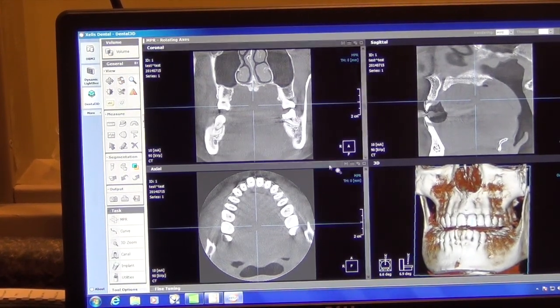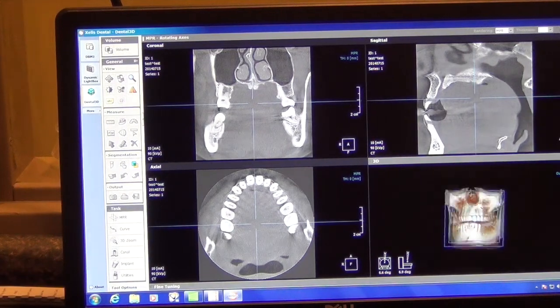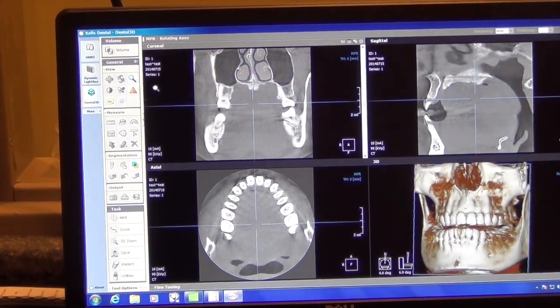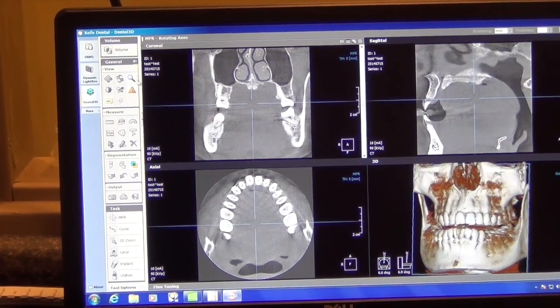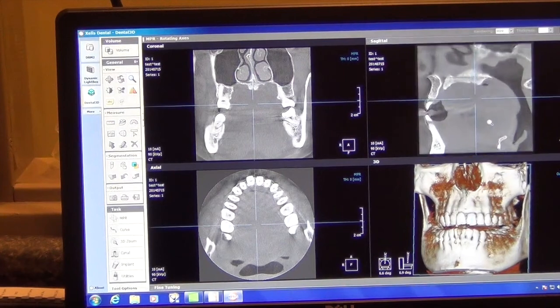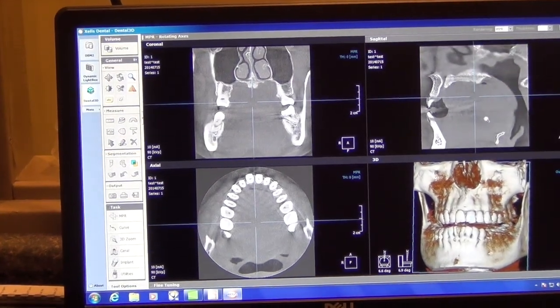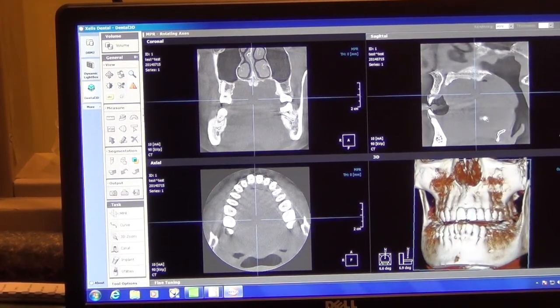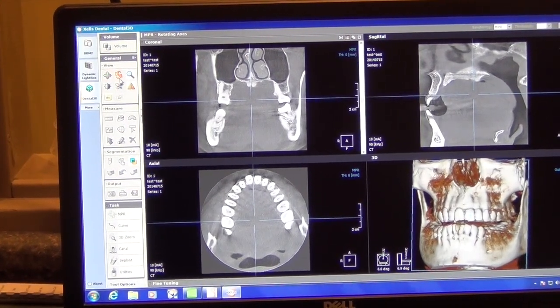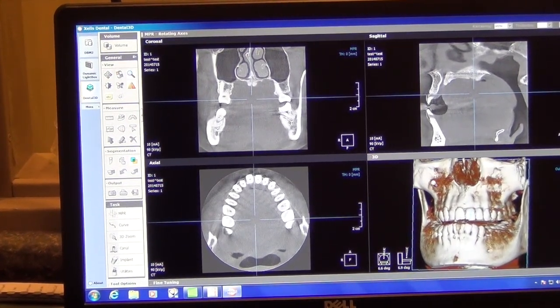I can also do a zoom. Single left click, zooms in and out. Now, when you're zooming in and out, are you using your wheel or is it? For this instance, using these tools in the top left corner, these are determining what happens when you use your single left mouse button, click and hold.